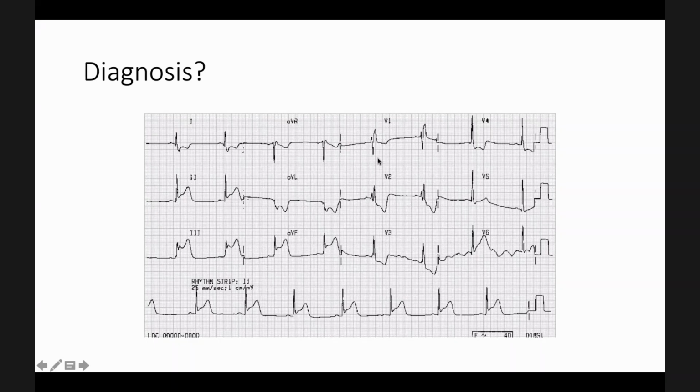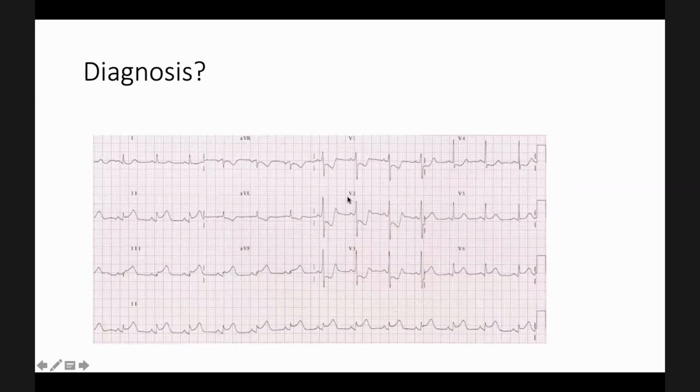Other than this, what is the patient having? Yes, right bundle branch block is also there in this ECG. What is the diagnosis here? You can see sinus rhythm. Why does the patient have bradycardia? It's a complication of the right coronary artery, because it supplies the SA node and the AV node also, so they can get bradycardia as well.